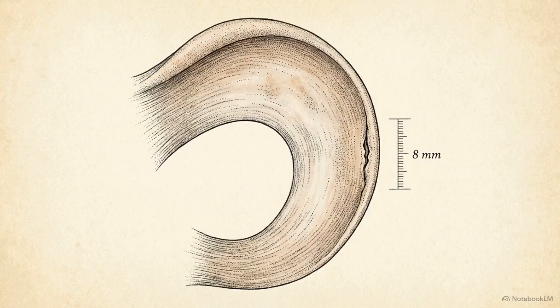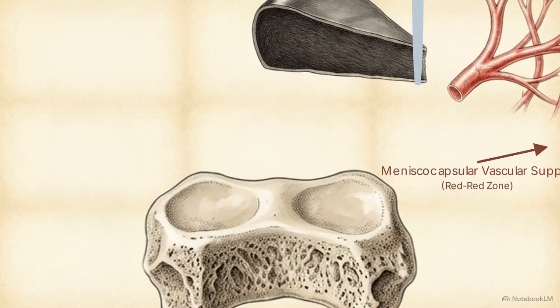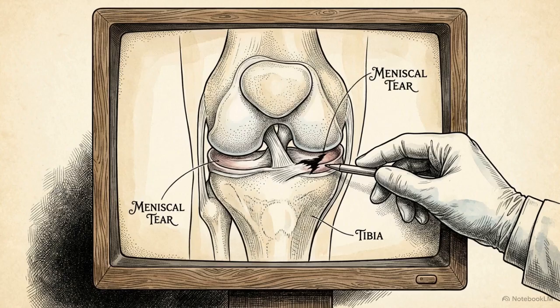If the probe reveals a stable tear, particularly one under 10 millimeters, the high local vascularity often allows the lesion to heal completely on its own without intervention. Therefore, the radiologist's core responsibility is not to plan the specific suture trajectory, but to precisely localize the injury within the posteromedial compartment.